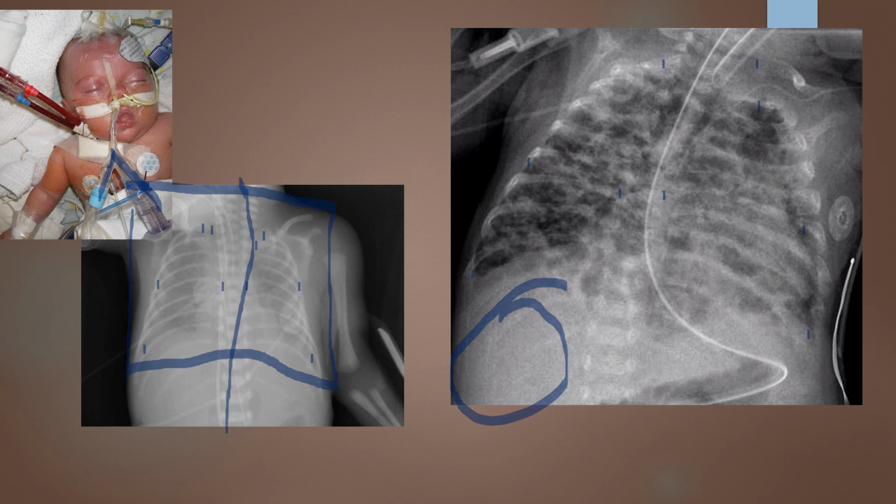Mid-coronal tilting, I see a clavicle way up here. It's hard for me to identify anterior versus posterior ribs. So I'm going to repeat this exam, correcting the mid-coronal rotation, putting the baby's face facing upward, and correcting our technique.